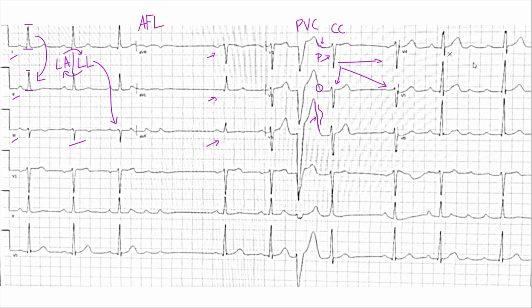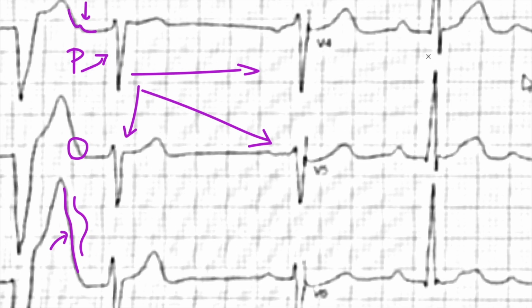All right. Now this over here looks a little bit strange. Why do I say that? You could say that that's an S wave, but that's more like a dagger-like S wave. So you just get a straight shot down and up, right? Normally a wave will have a little bit of space between the sides.